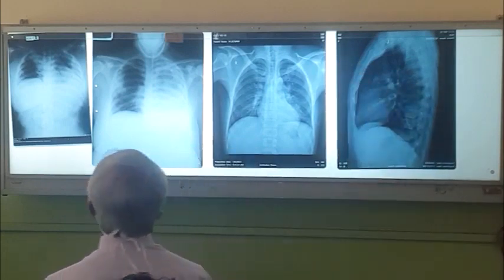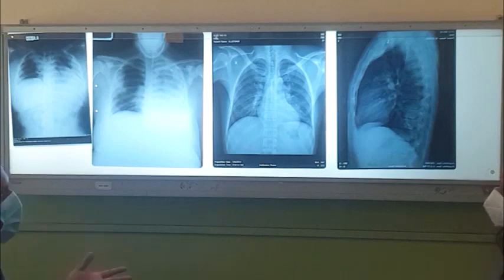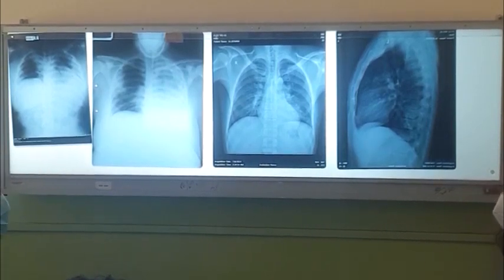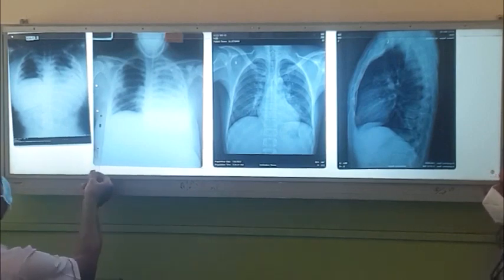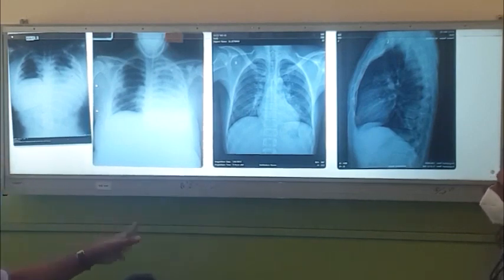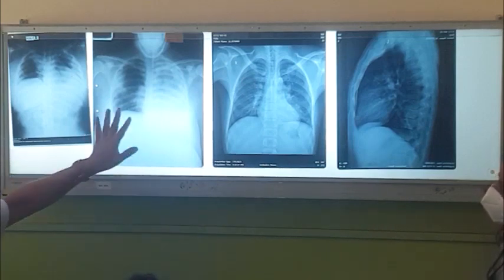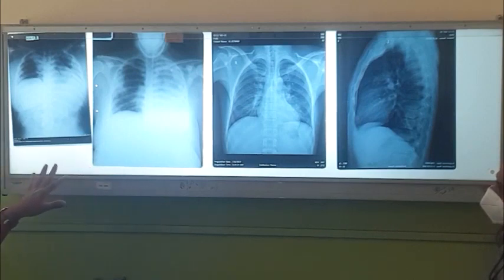Right. If you look at this X-ray, in the ICU you can't do PA films. You are supposed to do AP films. When you do AP films, the patient is keeping the hands like this, so you will see overlapping of the scapula there. So it's an AP film. And then it must be an obese patient, right? Deep chest wall. Then you can see the whole spine. Although it looks whitish, you can see the whole spine. So this is an overexposed field, right?